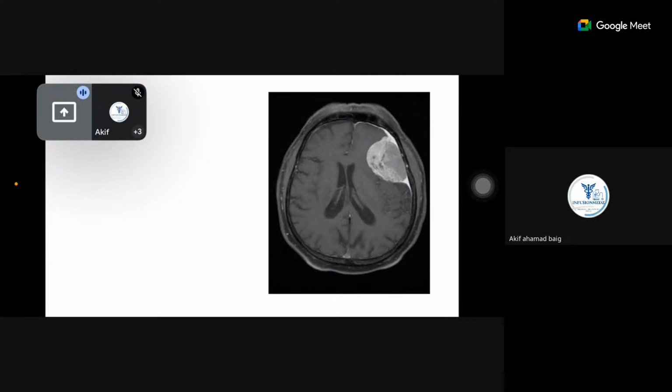Yeah, this is important because they'll ask you. Some examiners have favorites, so make sure you know what a dural tail sign is. You can see the dura being tail-like, tapering towards its end, because this is arising from the branches.